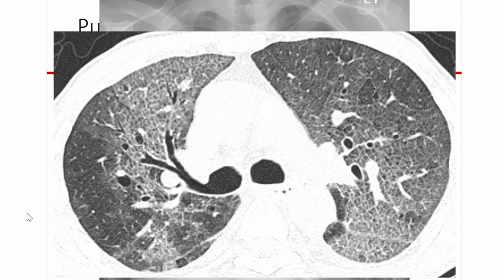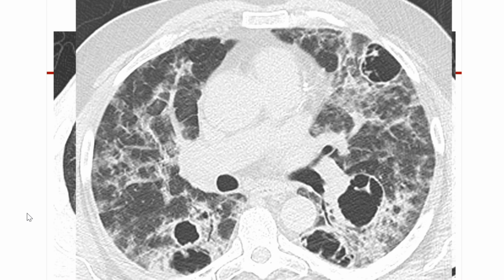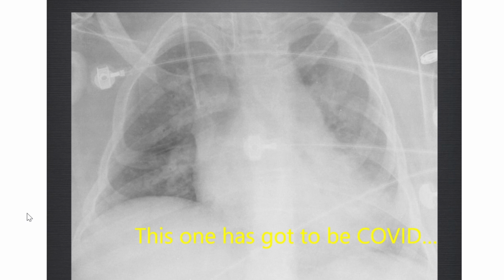PJP, again, I said I was going to give you better examples of crazy paving, interlobular septal thickening that we can see sometimes in edema, sometimes in hemorrhage, sometimes in PJP. All right, so obviously this is someone with chronic steroids and has titers for PJP. These are the chronic pneumatoceles that can sometimes be cavitary and thick, or sometimes more cystic.